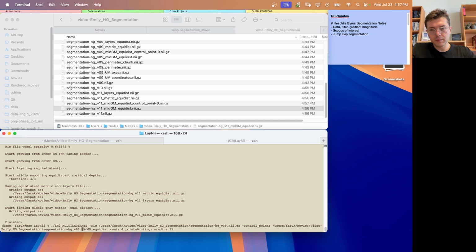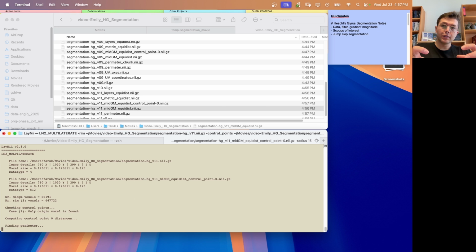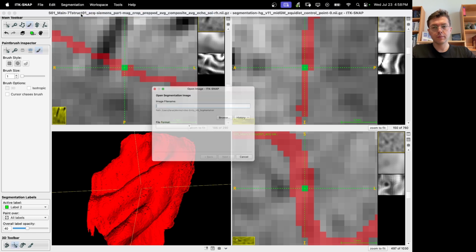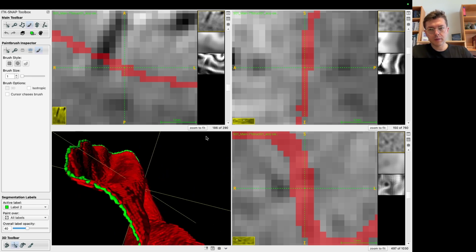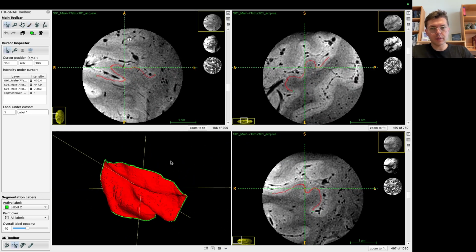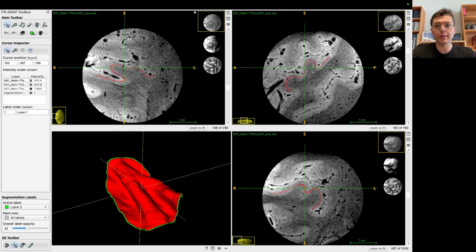Okay, now let's rerun multilaterate. And hopefully our disk will be within the geometry that we segmented. Okay, perimeter came out. Load it here. And yes, it is basically a continuous line, as you see. Our disk is now sitting nicely on top of the Heschl's gyrus. So this area will be parameterized and turned into a disk.